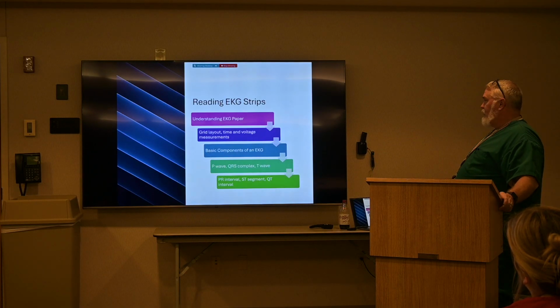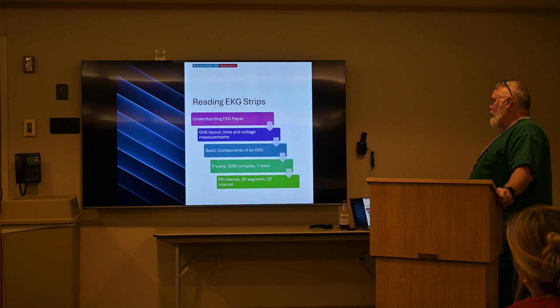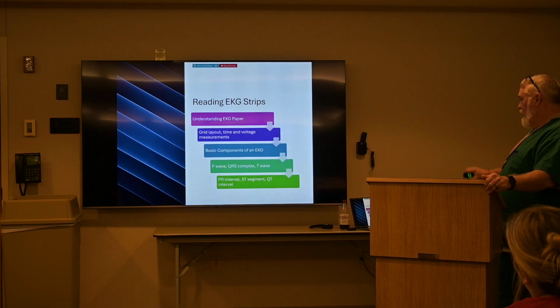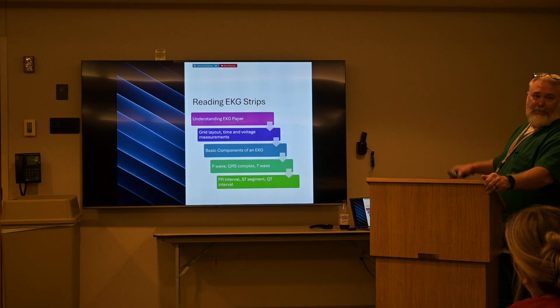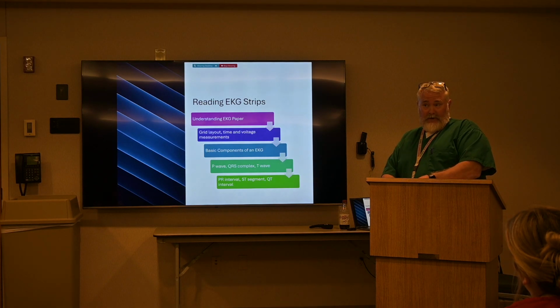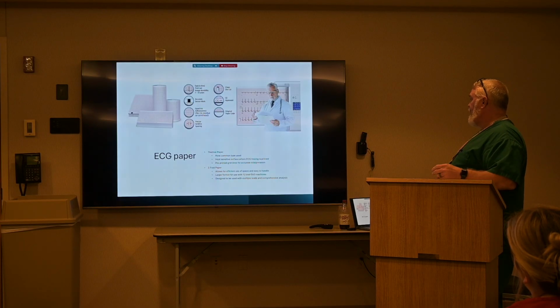So, reading EKG strips, your ECG strips. We're going to talk just briefly about ECG paper, grid layout, timing, voltage measurements, a little bit about the basic components of an ECG, EKG, and then we're going to talk about the different aspects of a PQRST complex. Any questions thus far? I know I'm moving along kind of quick.